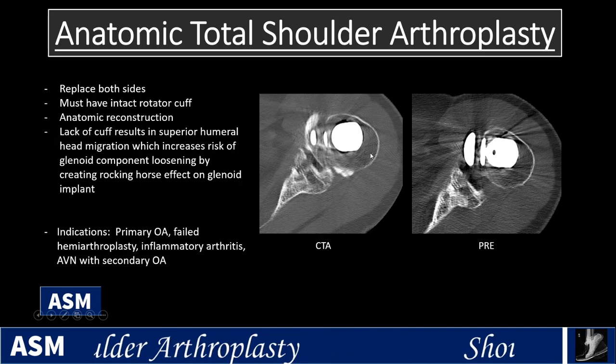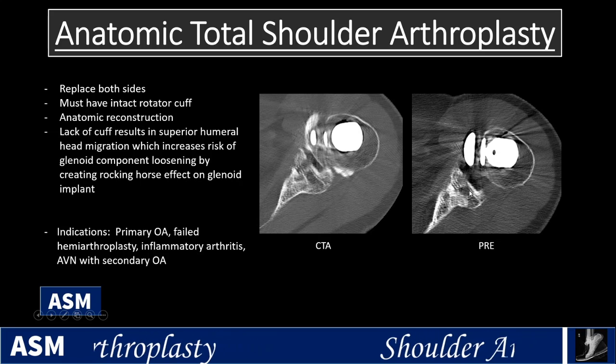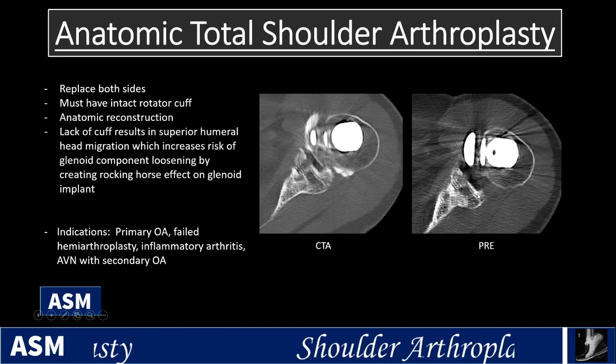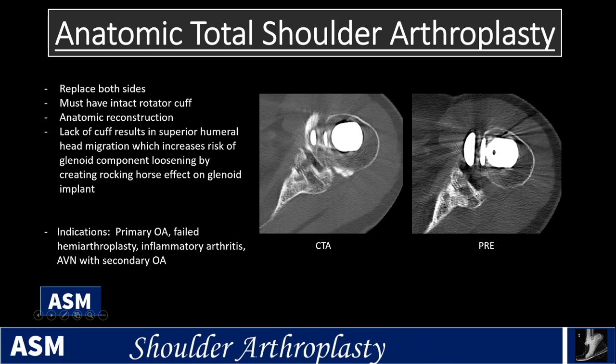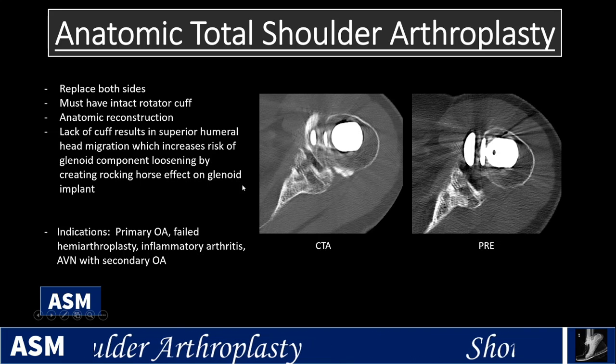So we typically do a pre-injection CT as well, just so we can compare the two. And here you can see, before we do the injection, the high-density material underneath it. So this is actually cement and not contrast getting underneath it.